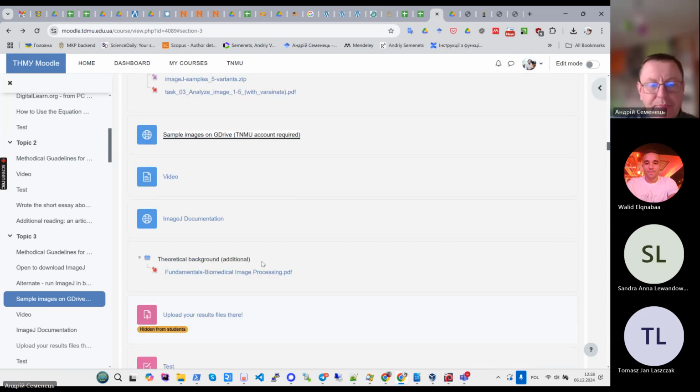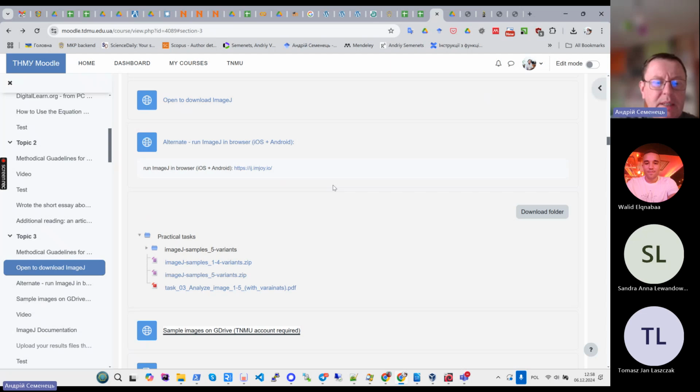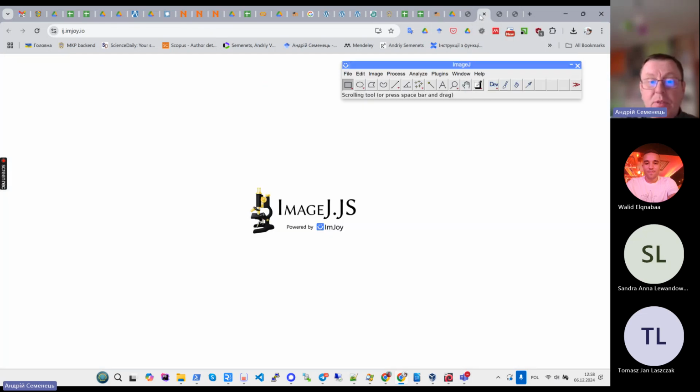Okay, so let me show an example of how to use this application. And I want to add two notices.